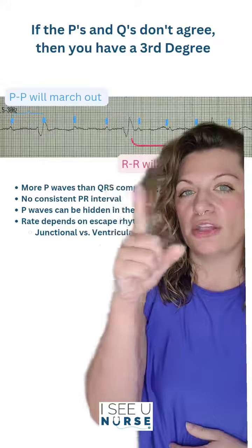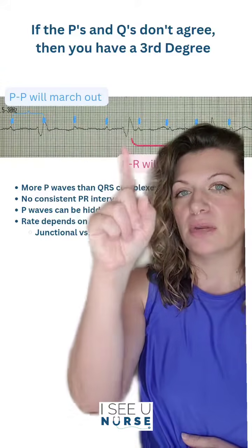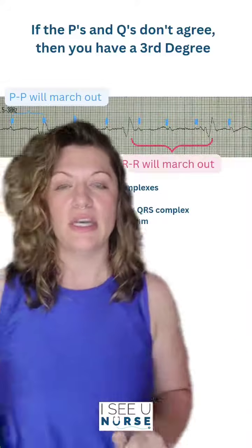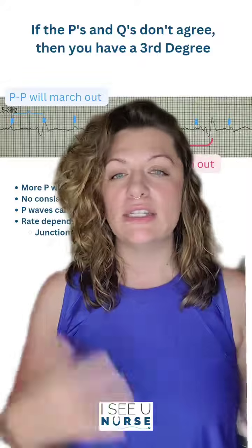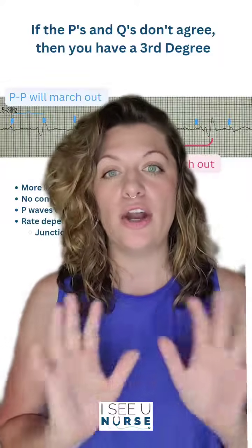We can see that on this third degree heart block EKG strip that all the P to P's are going to be marching out very consistently. We can also see that the R to R interval is also going to march out consistently. However, there is no consistent PR interval. There are more P waves than there are QRS's. You can just tell that they're not meshing together. There is no communication at all.